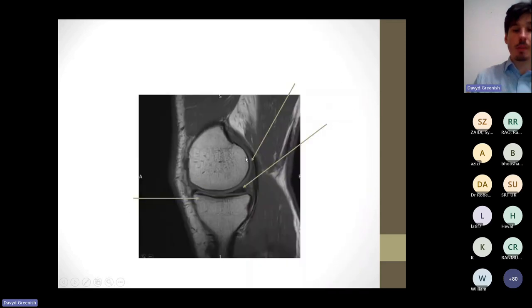Okay, just in the interest of time, we'll go through these ones. So is this medial or lateral? I just want people to pop in the group. Is this a medial or lateral sagittal view of the knee? And feel free to chuck out any answers if you would like to. Good work on the plantaris though, guys. That was a really tough question.